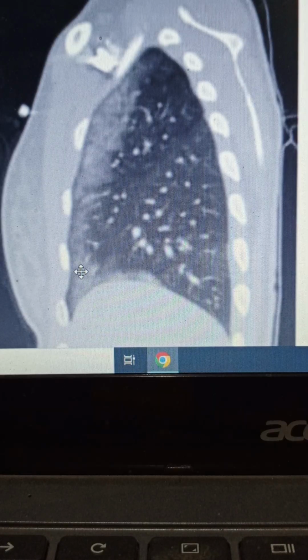So whenever you have an emergency and you see a patient who has had trauma and developed ground glass opacities in less than 24 hours, remember he is having a pulmonary contusion. Whenever a patient develops ground glass opacities and has a history of motor vehicle accident, you should suspect that this patient is having a pulmonary contusion until proven otherwise. So this is a classic finding.